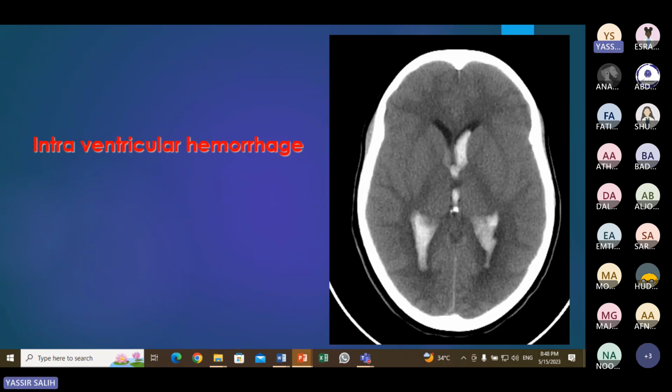Where is the hemorrhage here? The intraventricular. What is this ventricle? We talked about it before: lateral, the left anterior or frontal horn. And what is this? Anterior horn.